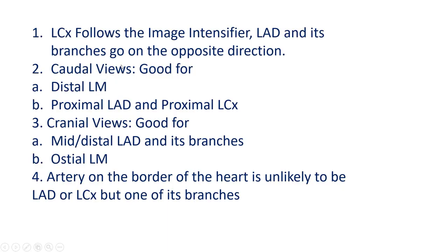Other rules that it's important to remember, that the caudal views generally are good for distal left main, proximal LAD and proximal circumflex. Cranial views are generally good for ostial left main, mid and distal LAD and its branches. This rule number 4 is very important, and it's going to help a lot. The artery on the border of the heart is very unlikely to be the LAD or the circumflex. It's most likely to be obtuse marginals or diagonal.